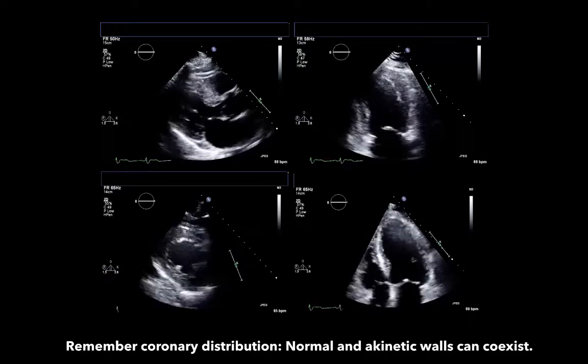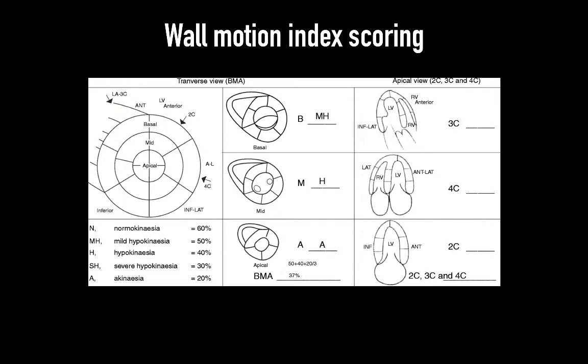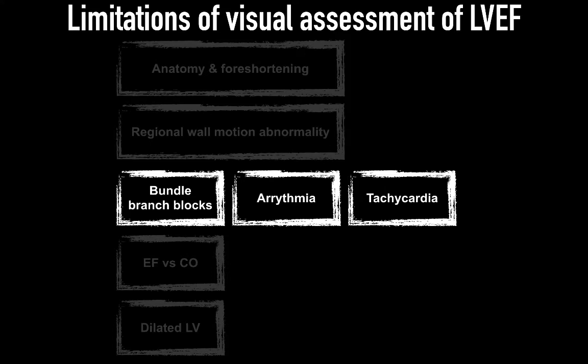The key message is that multiple views should be used to assess the ejection fraction of the LV. A wall motion index scoring has been developed to quantify LV assessment, to assess the function of every wall and to eventually average them. This method assumes that intact walls cannot overcompensate for dysfunction in other segments. In real life, this is often seen and can lead to significant improvements in near normalization of the LV ejection fraction. The next thing we'll talk about is the role of arrhythmias and tachy and bradycardia in LVEF assessments.